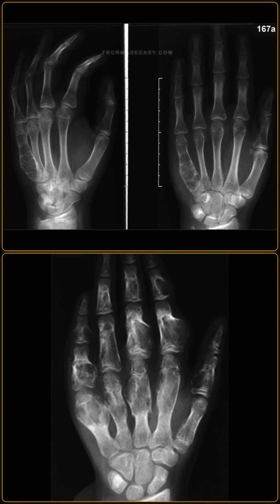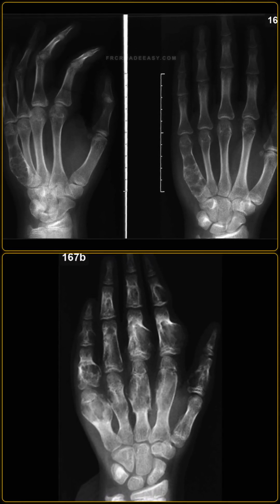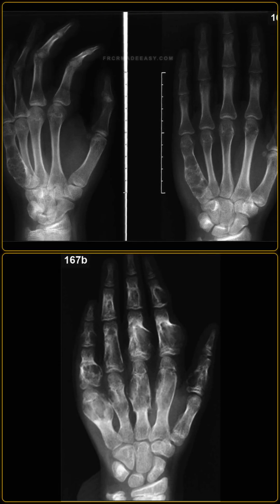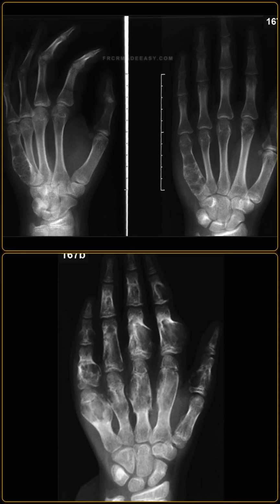I am showing you a radiograph from another patient with multiple similar lesions. Describe the findings and name the syndromes associated with this condition. Okay. This radiograph demonstrates multiple expansile lucent lesions throughout the tubular bones of the hand, consistent with multiple enchondromas.